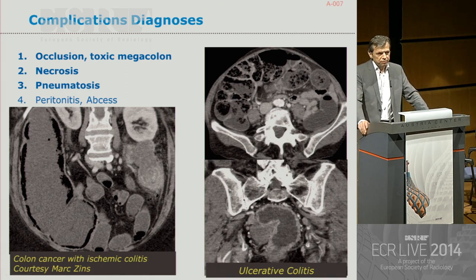And you have to be worried about this kind of patient with an area of left colon inflammatory change, especially in ulcerative colitis, and the beginning of distension of the right colon, because these are the patients that will go on to risk necrosis and toxic megacolon. On this image, you can see a patient with a necrotizing right colon area due to an ischemic change upstream to a left colon cancer, which is clearly identified on this area with a pneumatosis.